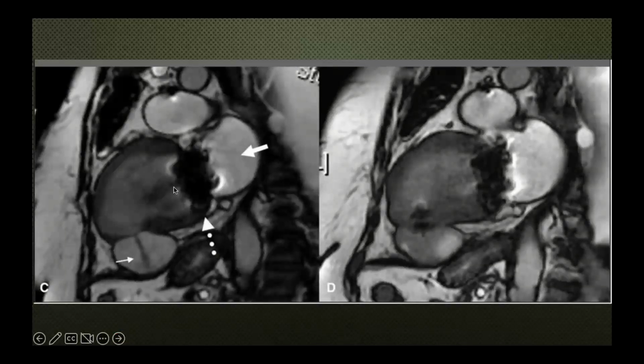And here you can see, usually this diagnosis is made by echo, but if these patients are stable enough, they can get other imaging modalities. And here you can see a cardiac MRI. Over here, the big arrow shows the left atrium. There is a mechanical mitral valve and the left ventricle. And you can see here in the inferior wall, there is this huge connection between the LV and the pericardium with a blood-filled cavity and a hypodense jet that's going into the pseudoaneurysm.